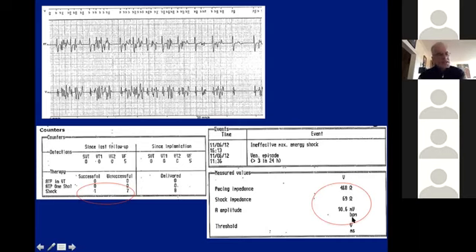How do the leads actually fail? You see a lot of examples. There are possibly 3 different ways. You see patients with high impedance or low impedance, right? You see patients with noise on the leads, or you can see a combination of those. In some observations, it looks like the noise may actually precede the development of impedance changes. In this particular case, you see that. Impedance is normal, but the patient had noise, indicating that the lead is disintegrating.